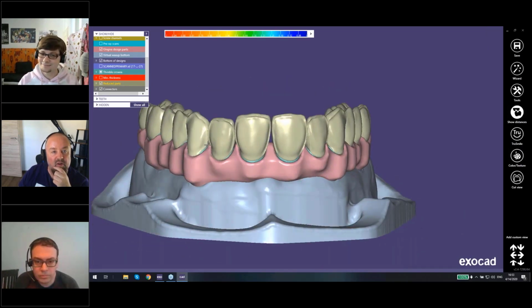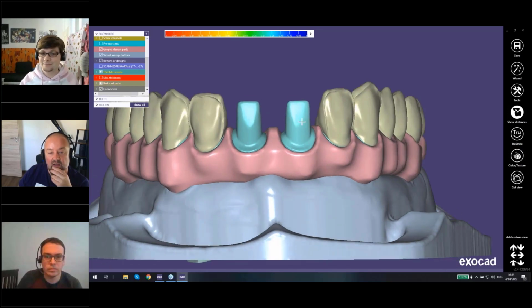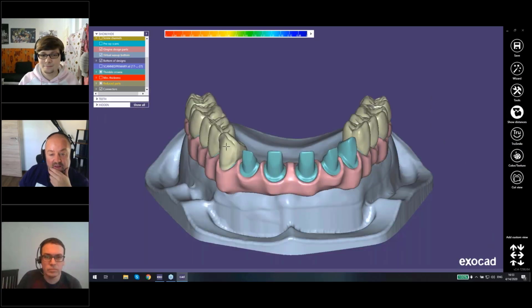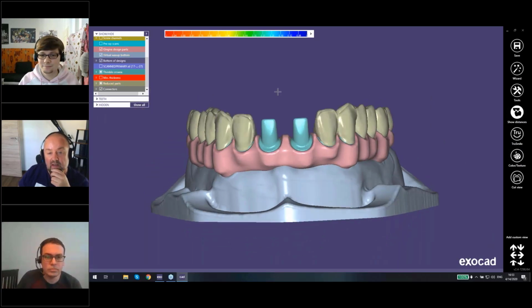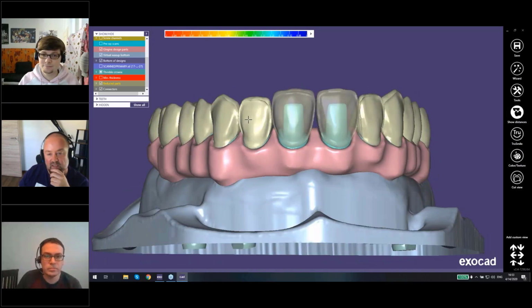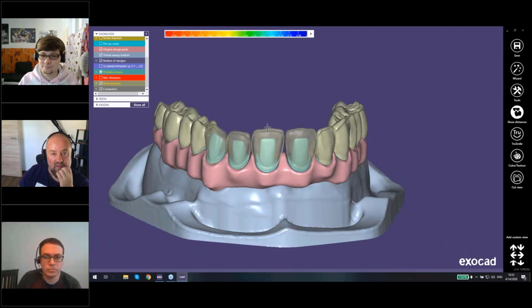Sometimes the primary framework of the thimble shows a lot of undercuts for the milling. How can we correct it? Even 5X machines do not mill it properly. Okay, normally the thimbles have been designed in a way that there is no undercut in the thimble itself, and the tool diameter is already considered in the shoulder here of the thimble.